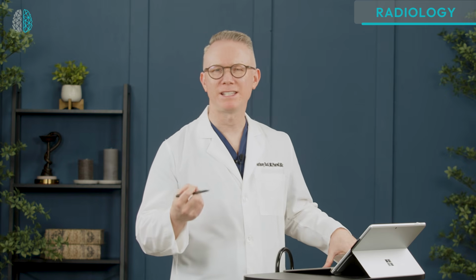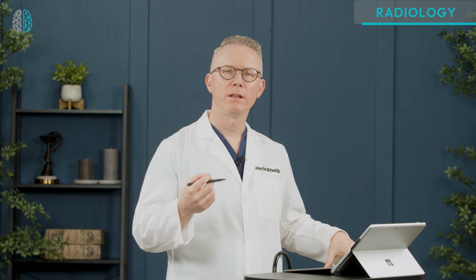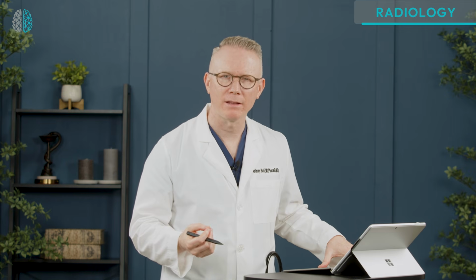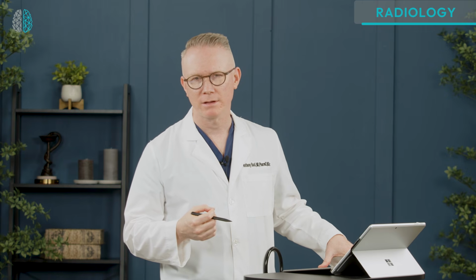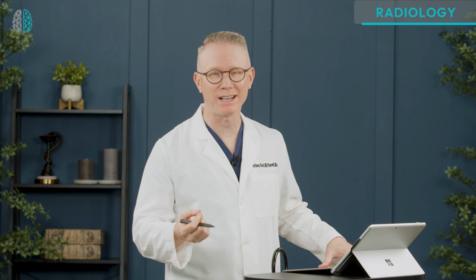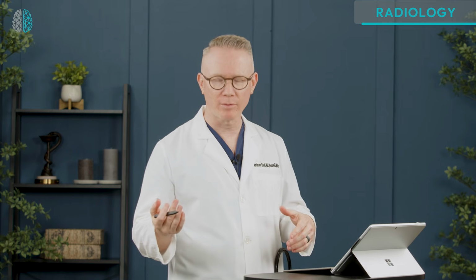So why does this matter? One, rotation can make one lung look more lucent, and the other sometimes more opaque. Two, the rotation can distort the cardiac and mediastinal silhouette, mimicking things like cardiomegaly, mediastinal shift, and even hilar enlargement. Okay, so one of the things that I think is very important and valuable is that you see an example of what that looks like. So you compare the normal to the abnormal.